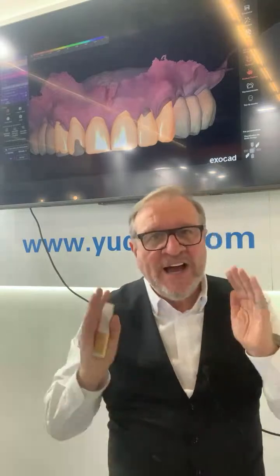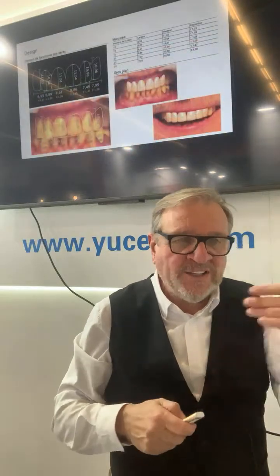Okay, we correct and see, okay, it's right. I have to make a mock-up. So, to make a mock-up is to finalize the design. You see the curve, you see the contact point, all the detail we have just seen before is in it. And now we can go and put some mock-up, some veneers on it. So this is the result with the 2D. I can share with the patient with the 2D information.